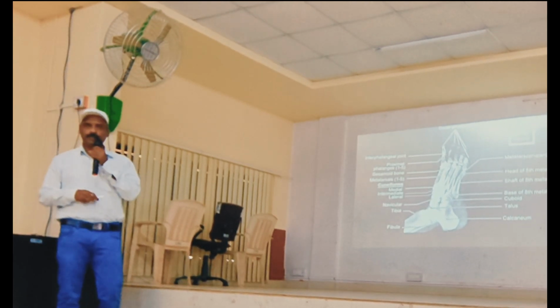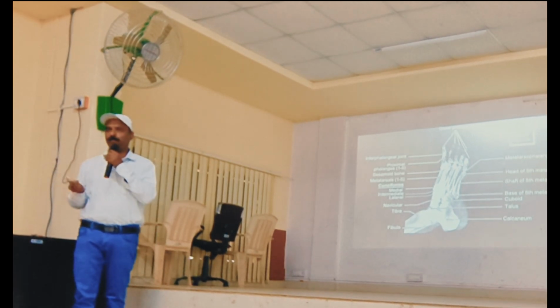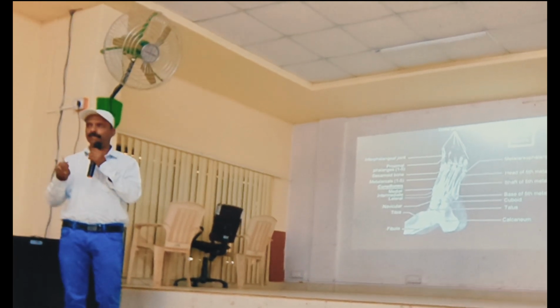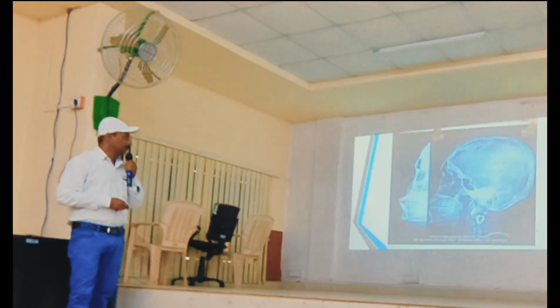You can take this view when there are fractures of the phalanges, metatarsals or tarsal bones, and, as I told you, for sprains and strains of the ankle.